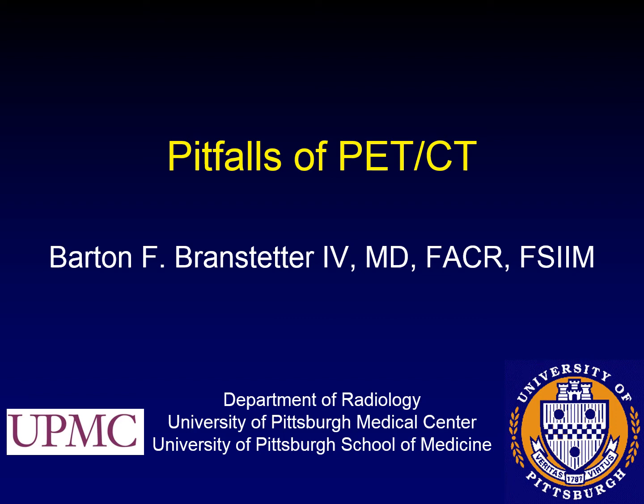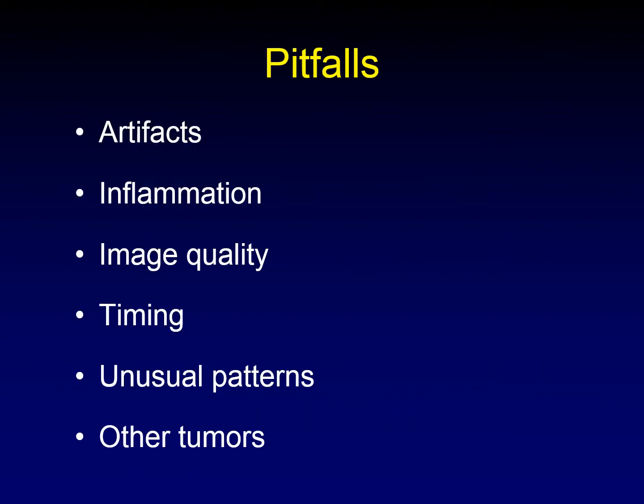PET-CT is a powerful tool for assessing patients who have been treated for malignancies of the head and neck, but interpretation can be complicated by the effects of treatment and by artifacts that undermine our sensitivity and specificity. We'll start with a discussion of some basic artifacts that occur in PET-CT.